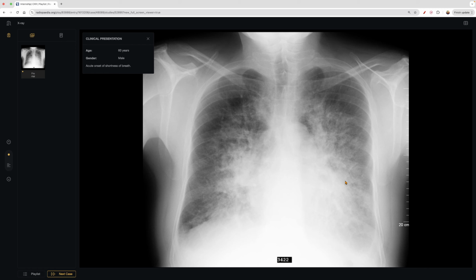Interstitial opacity, consolidation, atelectasis, nodules, and masses. So this certainly doesn't look like atypical pneumonia, right? The interstitial opacity, the hazy appearance. Yes, it is hazy in general, but it looks more like a consolidation because it's continuous. It's all together. And so that was the left side.